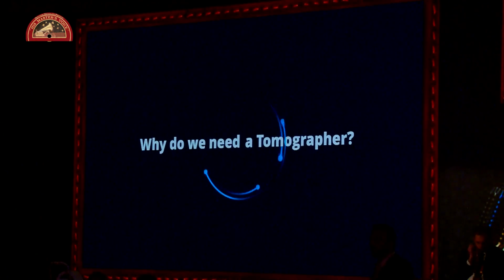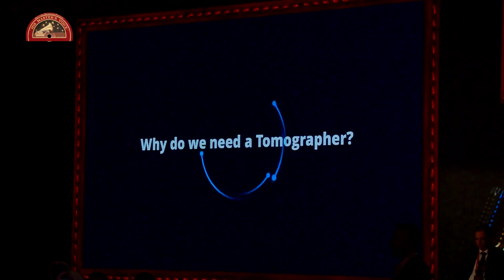The question arises that yes, we are talking about topography. I'm convinced that yes, we need topography. But why do we need tomographers? Well, let me take you through another case where you have an interesting person who has come with a report where he was posted for LASIK somewhere else.